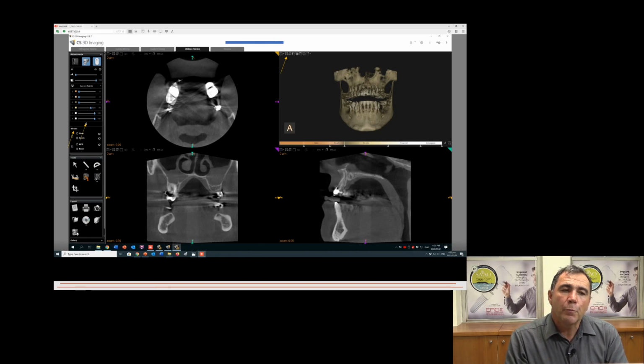And then, or third point that's important, is the three-dimensional image that is created. And with that, you can adjust the three-dimensional image, because that's going to give you an idea. You cannot make a diagnosis on a three-dimensional image, but it gives you an idea of where you are. And obviously, to take images and photographs of that images. The photographs I use extensively, just to remind me and to jot down, and also to make up my reports.